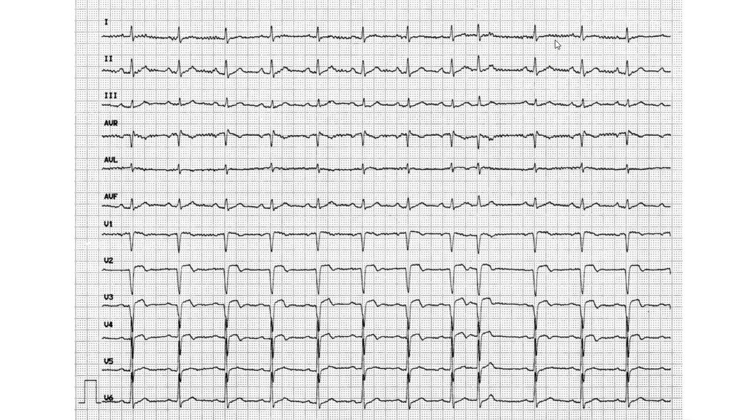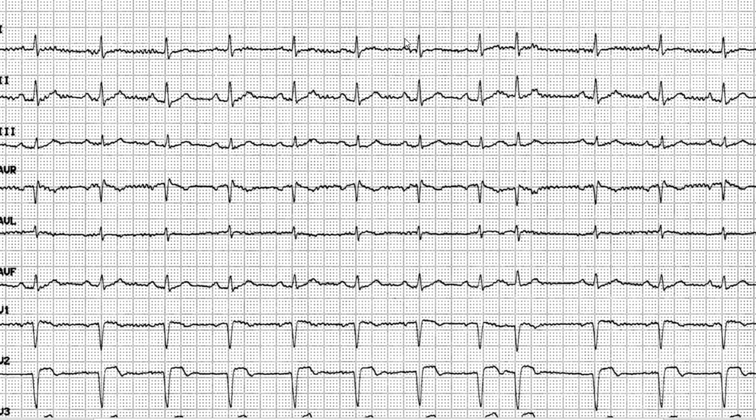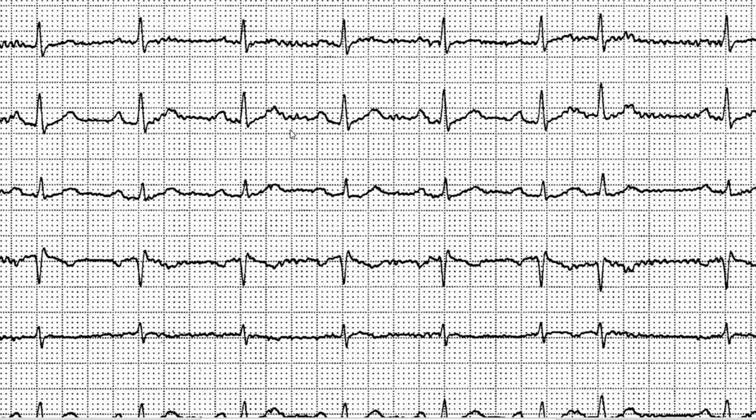But you're going to say, oh wait, what? There's jiggling all over the place, man. What do you mean P wave? There's definitely fibrillation. Oh, it's fibrillation, you say. So let us see the frequency of this fibrillation. I'm going to take these two peaks. The distance between them is 1 square. So a fibrillation frequency of 1,500, because 1,500 divided by 1 is 1,500. So you're going to tell me that this guy's magical heart is able to beat 1,500 beats per minute. I'll say no, fam.